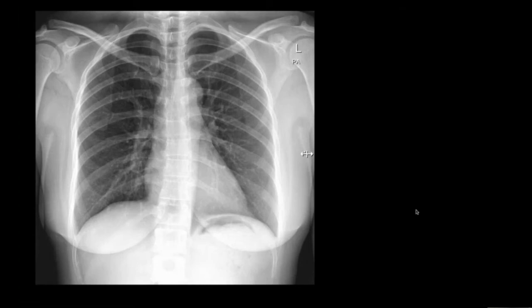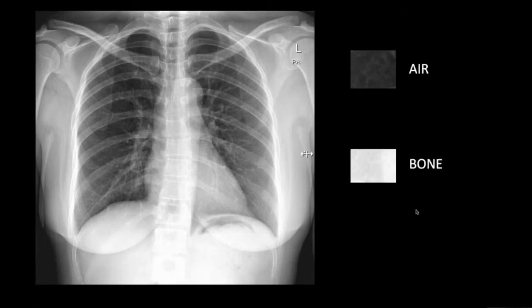Before we go straight to the anatomy, it is important to know the normal density of chest radiograph. The lungs, which are largely composed of air, appear dark on radiographic image due to more X-ray radiation reaching the machine detector following low absorption of the radiation by lung tissues. On the contrary, the bones, being high-density structures, appear very bright due to high absorption of the X-ray radiation by the bones themselves, leaving less X-ray reaching the detector. In general, the density of the soft tissue structures will be somewhere in between the lungs and bones.